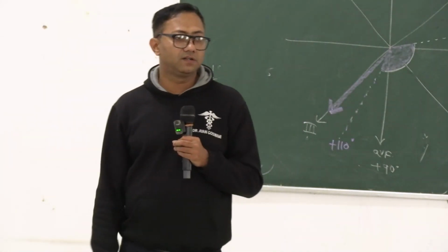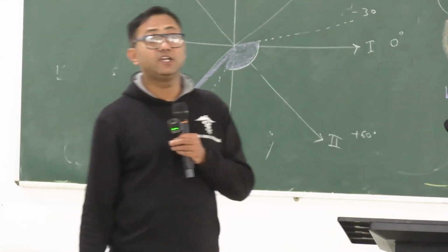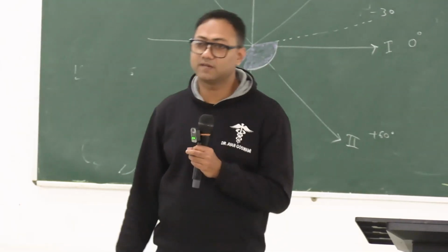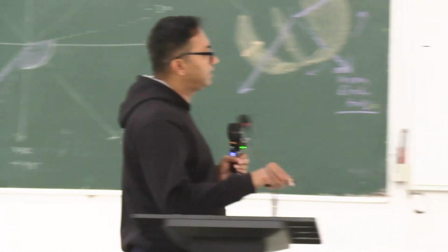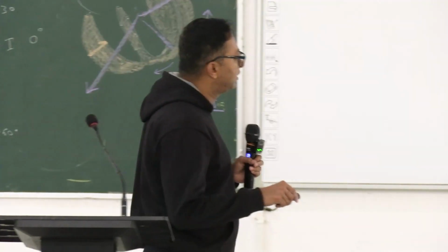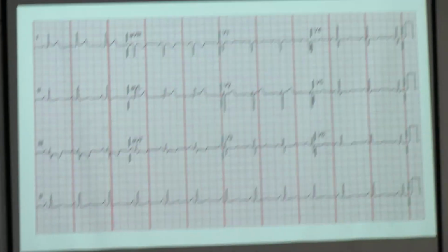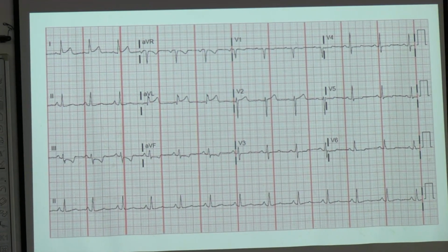So the PR interval. What is the PR interval? I told you that the PR interval is from the start of the P wave to the beginning of the Q wave. PR does not mean P and R; PR means P and Q. Look at the lead II long tracing: the start of the P wave is this point and the start of the Q wave is this point. From the beginning of P to the start of Q. Let me draw a large ECG complex over here.